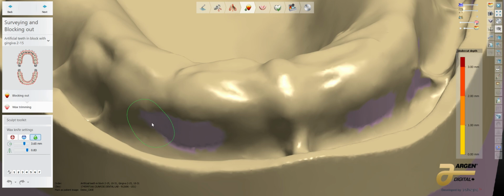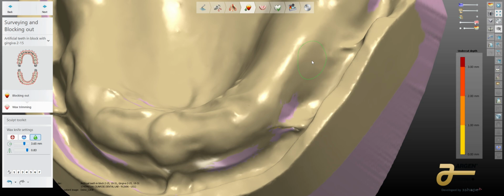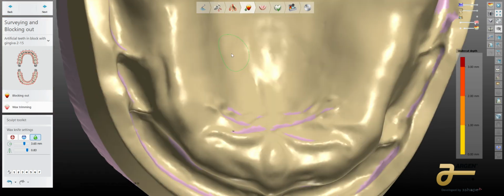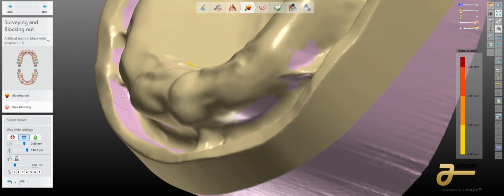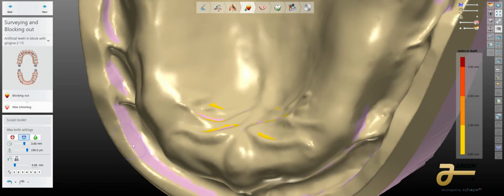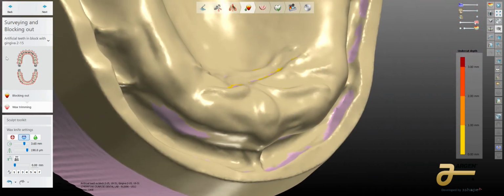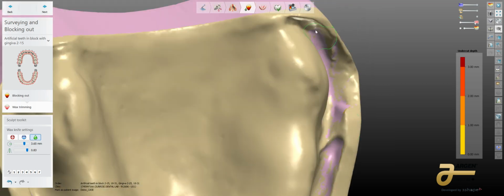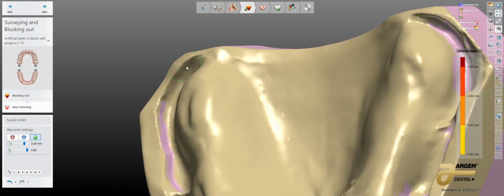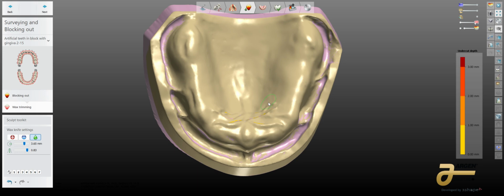So on a denture such as this, we could be really, really safe to just smooth this stuff out so that we don't have a big blocked out area here. If you want to take it away, you can take it away. It's literally not going to affect anything. This outside edge for the undercut, you know that's not going to be, and there's a lip there. So this part's just going to smooth that border. So what I like to do is I always use this smooth tool on the outside edge. Just come around really quick, and that's going to seal off any angry triangle in the mesh, and it's going to make a much nicer peripheral roll for us.